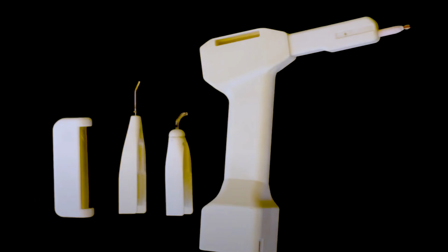Recently, a company, Nuvotech Medident Incorporated, Vancouver, Canada, has developed a single pulp tester device, PTD, for dental pulp testing. This single unit is easy to use and is capable of providing safe and measured amounts of cold, heat, electricity, and light during pulp testing.